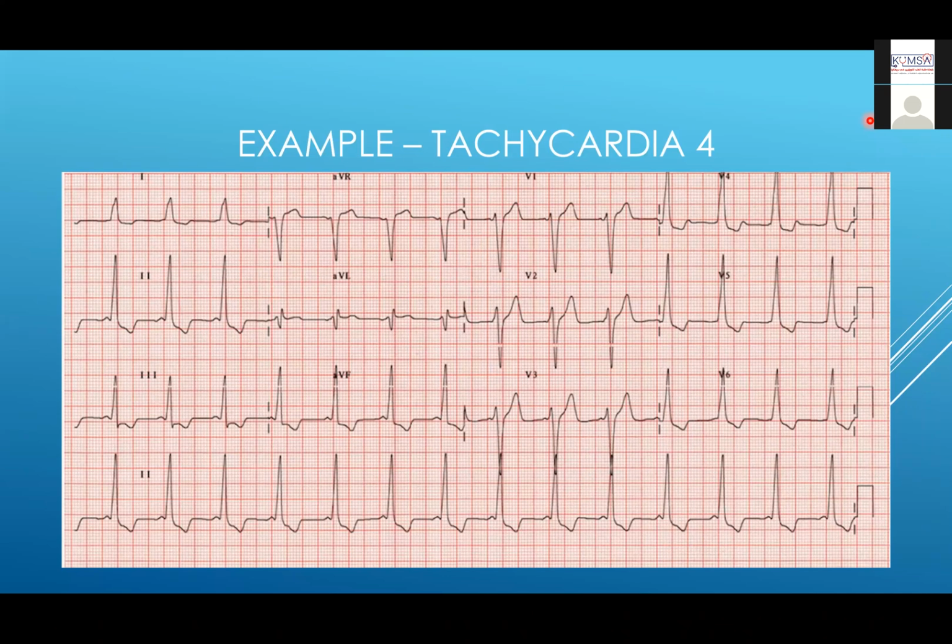Okay. Hyperkalemia? So let's take it step by step. Tell me about the rate. The rate is 1, 2, 3. He's tachycardic. I didn't fully calculate it, but I can see several R waves, and the RR interval is shortened.